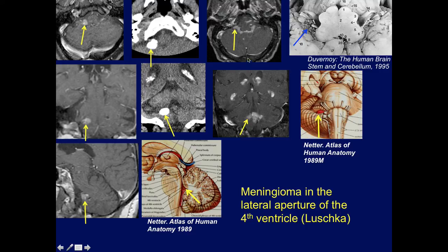This is not the same patient. These are normals. Forgot to put normal on these images. So this is, as Gino said, meningioma of the foramen of Luschka, calcified.